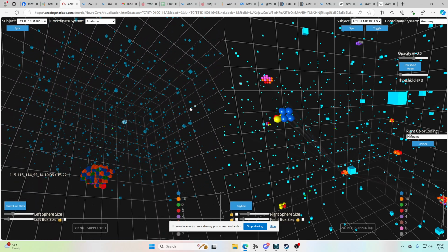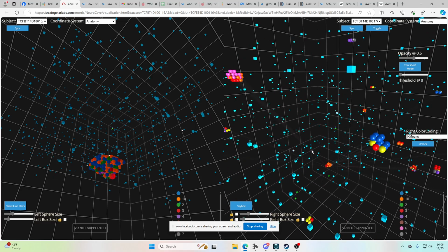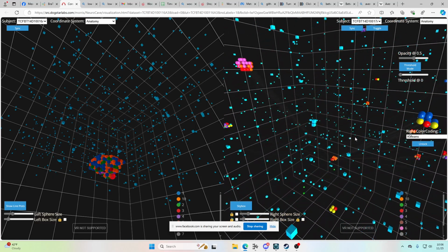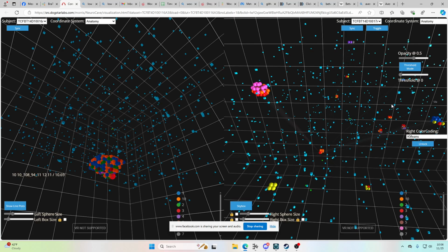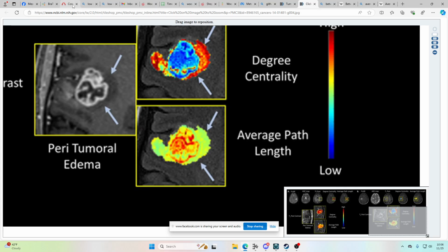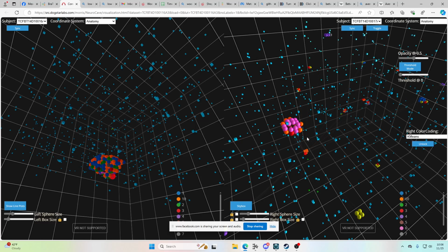But if we wanted to focus on analyzing in depth how this patient with multiple tumors, how their tumors are related to one another, I run this paper's algorithm on the raw data set here, and I get a distance matrix, a similarity matrix between each region of space that is segmented as being in a tumor.